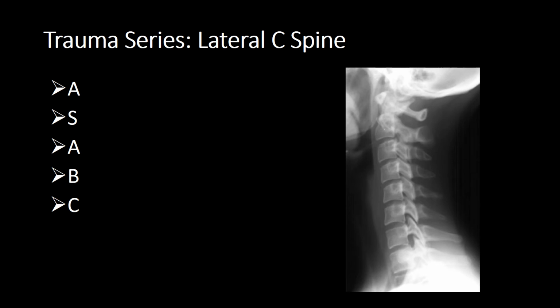Okay, let's assess this lateral cervical spine. A is adequate. We've got the skull base on. C1, 2, 3, 4, 5, 6, 7, T1, even a bit of T2. Yes, this is an adequate cervical spine.